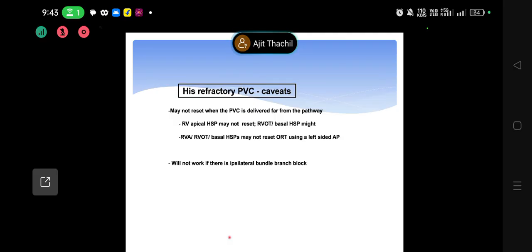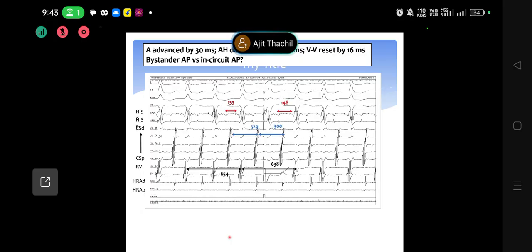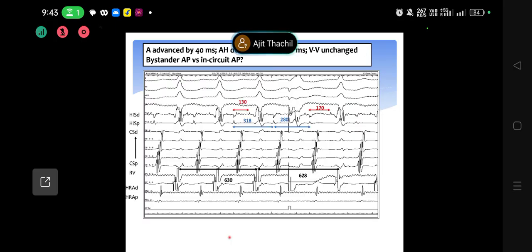And this one, you must always be careful. If the H is in this circuit, if the AH is in the circuit, consider that sometimes a decrement in the AV node might affect your measurements. So I'll stop with that.